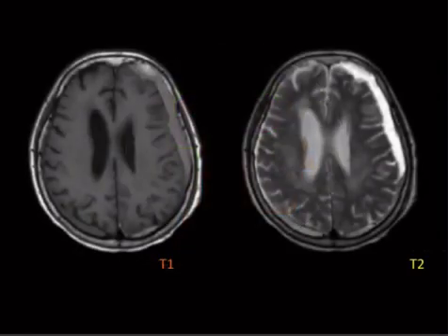Okay, next point here. This is very high yield and a confusing thing. I'm going to make an effort to explain it. So we've got a T1 and a T2, both showing a subdural collection of blood. And the question is going to be, when did this happen? So you've been hired by the forensic team to date the injury, and they want to know exactly how many hours ago this person had an injury.